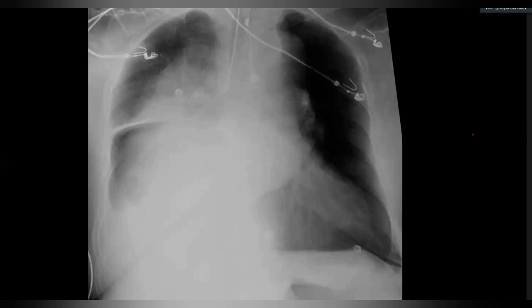The heart size also appears to be enlarged on this image, and there appears to be obscuration of the right-sided hemidiaphragm as well. And I can also appreciate some opacity behind the upper aspect of the heart on this image as well. I cannot appreciate the comment on the ribs. I cannot see them well. Some chest leads are visible here. So this is an opacified right hemithorax.